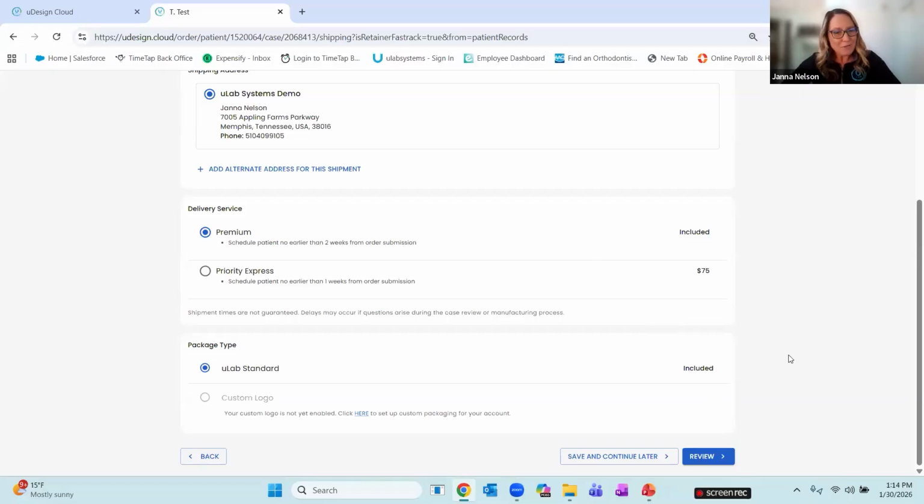If you have your custom branding set up, which we're going to cover as well, because I think it's a super important marketing tool for your practice, you'll have that selected as well. And then I'm just going to simply click review, make sure everything looks okay, make sure all of the retainers that I needed were added.